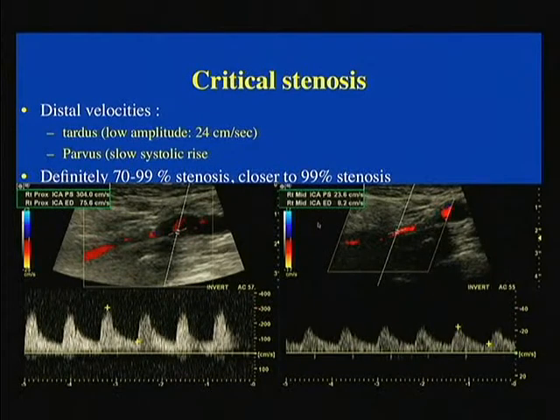I want to communicate to the clinician, don't wait till next month to do something about this patient. This is probably someone that should be seen sooner than this, because theoretically, they're on that curve. They could potentially be at higher risk for occlusion.